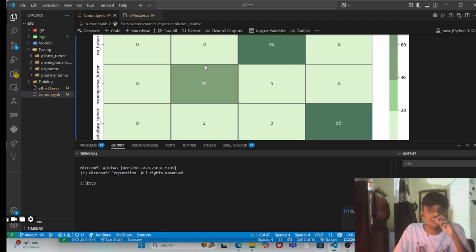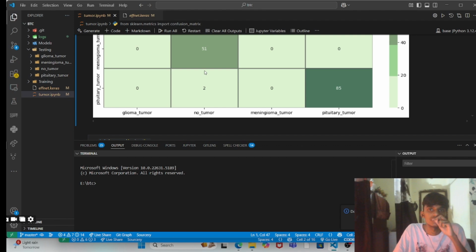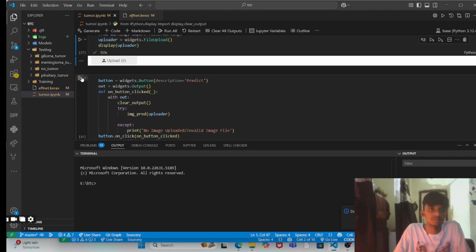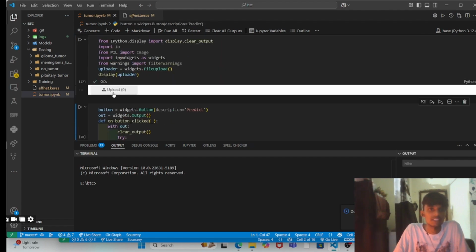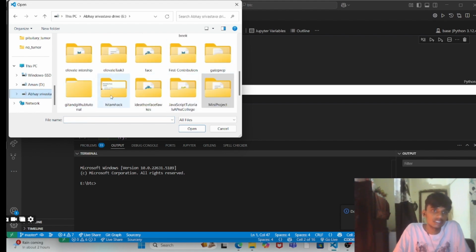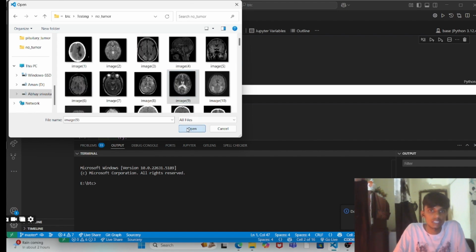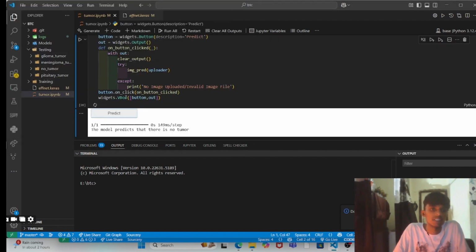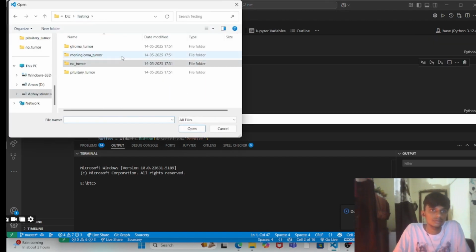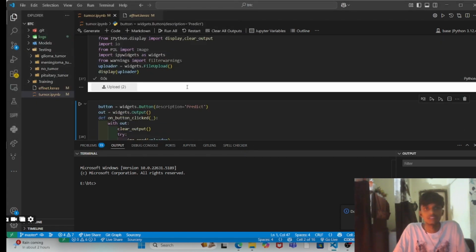Please. Okay. I don't know what's happening here. Model is not learning. Okay, let's run this and let's display. Let's paste the upload image. I'll be using brain tumor detection. There's a BTC folder for testing. I hope it predicts correctly. Please predict correctly. Okay.